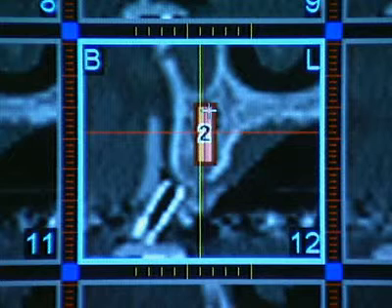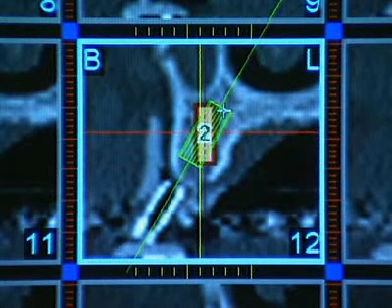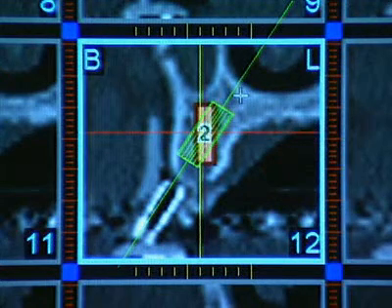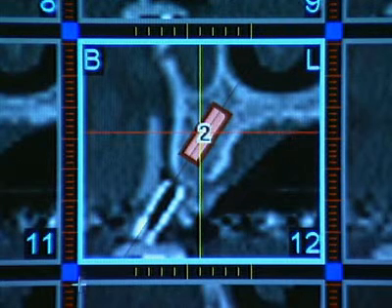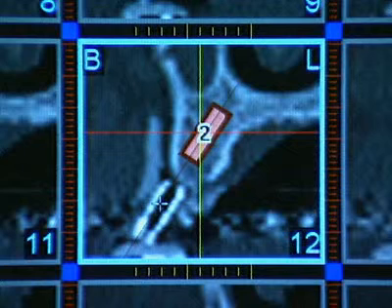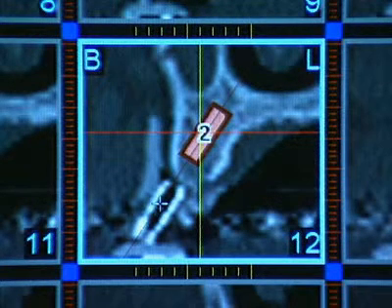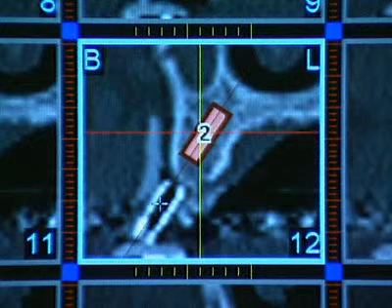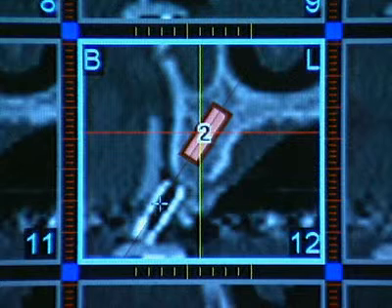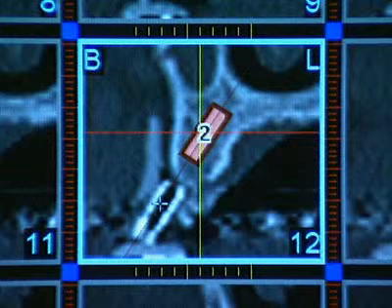Now, basic implant designs can be selected from a database and aligned in their definitive axial direction. Ideally, the implant axis coincides with the axis of the titanium cylinder. If the titanium cylinder is not correctly aligned, the angle at which it deviates is measured. In this way, the titanium cylinder can be adjusted in the planning template to its correct axial direction and can be used as a template for the surgical procedure.